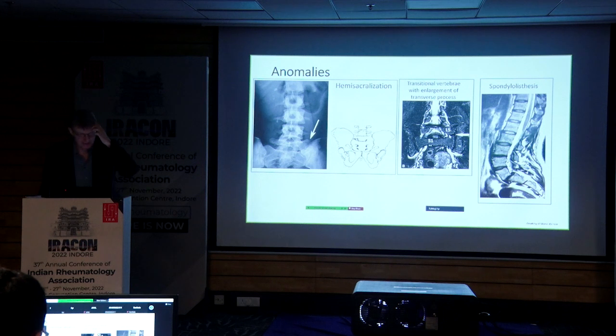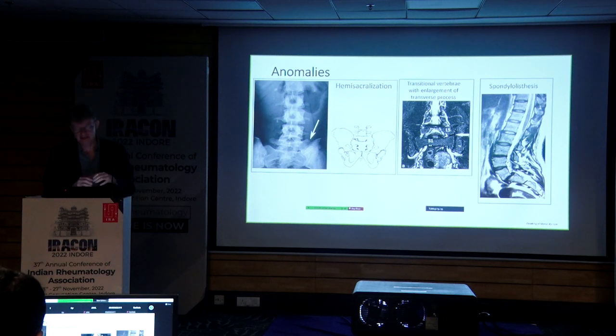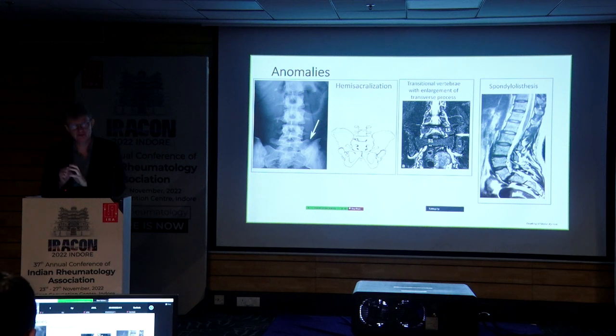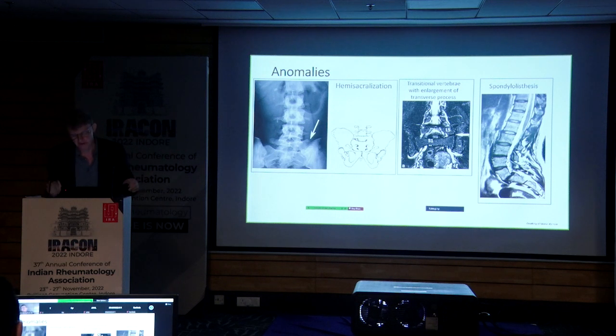I also showed one I didn't mention previously during my talk today. But this is of course abnormal. There may be a different mobility around such a person's lower back, and therefore it may give some bone marrow edema, both related to that area, but it could also be further down here on the other side, because of different mobility. So if there is a mild bone marrow edema somewhere in that joint, then say, okay, it could be due to this. If it's massive and looks like axial SPA, as in cases we had, then it's different. But mild bone marrow edema may not be due to axial SPA.